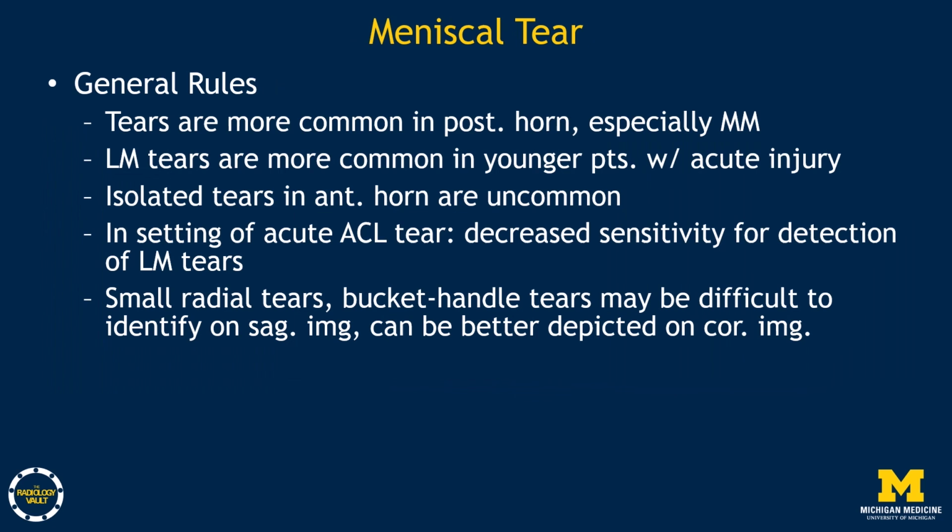Okay, some general rules of meniscal tears. Tears are more common in the posterior horn, especially of the medial meniscus. Lateral meniscal tears are more common in younger patients with acute injury. Isolated tears in the anterior horn are uncommon.